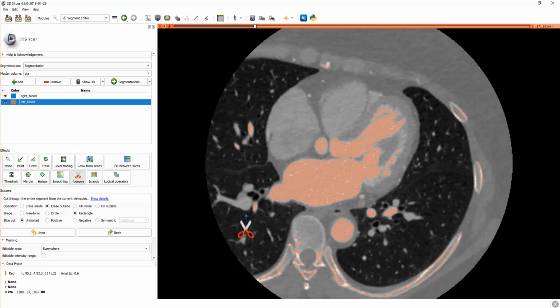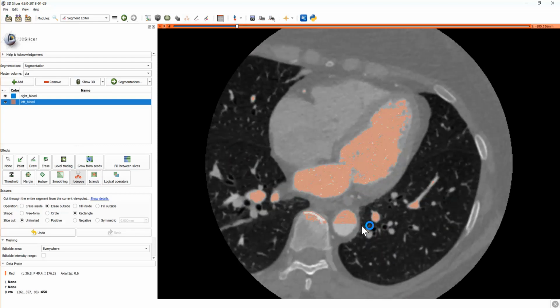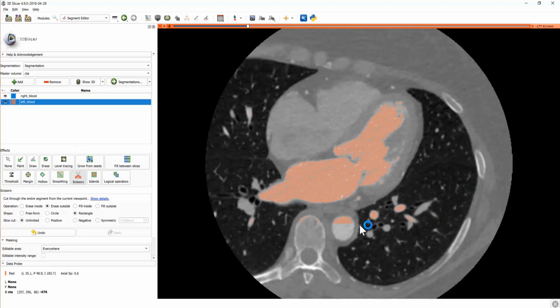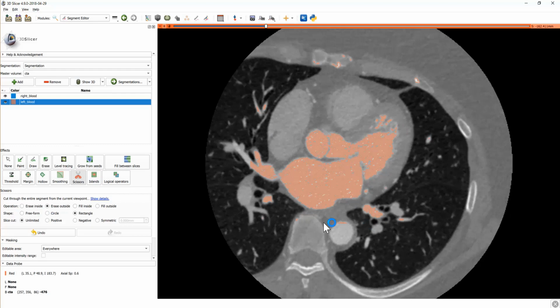And let's say I do this. Select a rectangle like that. And you can see then that cuts my segmentation across all the slices very quickly. So this is an easy way to just really get things segmented quickly and cut them off and have a nice flat surface as well. A lot of times you want your models to print out and have a flat base, and the cut tool is a nice way to do that. But we're not necessarily going to use that in our tutorial.